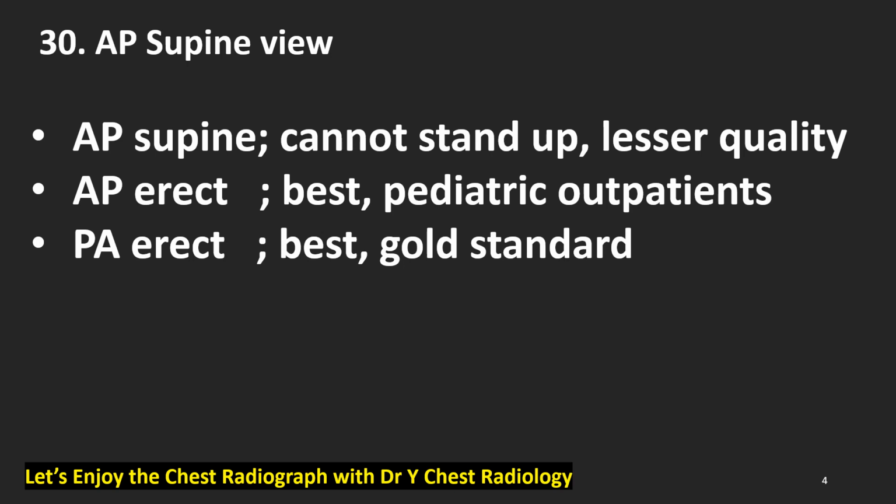What is an AP supine chest radiograph? It is for patients who cannot stand up, someone like ICU patients or who are unconscious. So the result is lesser film quality for diagnosis. The AP erect view is for pediatric outpatients. And the PA erect view has the best quality, the gold standard which we are very familiar with.